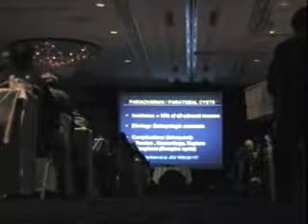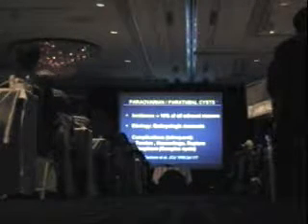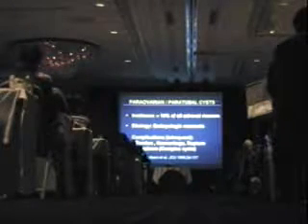Now, para-ovarian cysts or paratubal cysts are common. They are embryologic remnants. And the good news is that complications are very infrequent with respect to paratubal or para-ovarian pathology or conditions. So if I see something that is a paratubal or para-ovarian cyst, knowing it's an embryologic remnant, and the woman's asymptomatic and it looks simple, it's not going to go away. So I'm not going to worry about it. It'll be here if I scan her next month or two months from now.